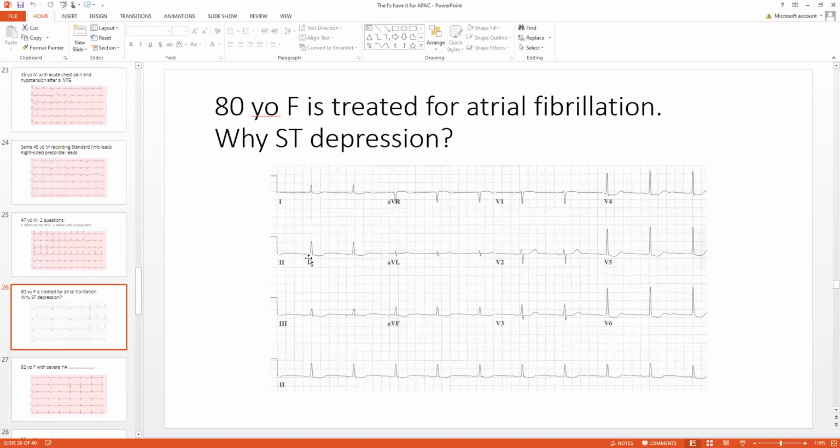Well, there's no longer atrial fibrillation. This is some type of supraventricular rhythm that's regular. It's not sinus because the P wave axis isn't sinus. It's, let's call it ectopic atrial rhythm. But the patient's doing great. The EKG shouldn't make you think there's ischemia.